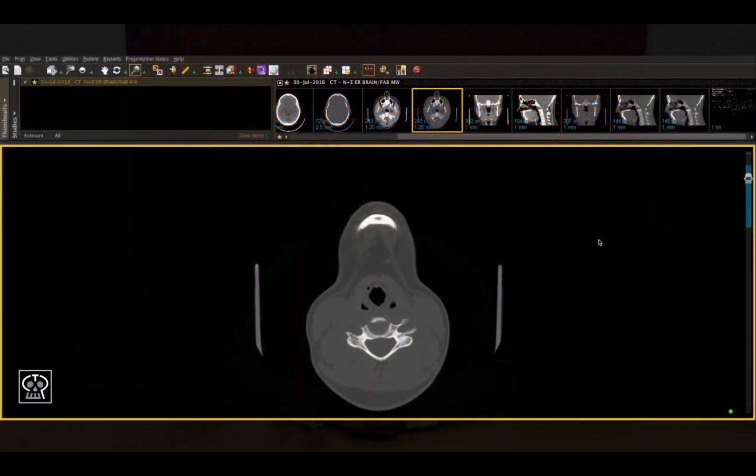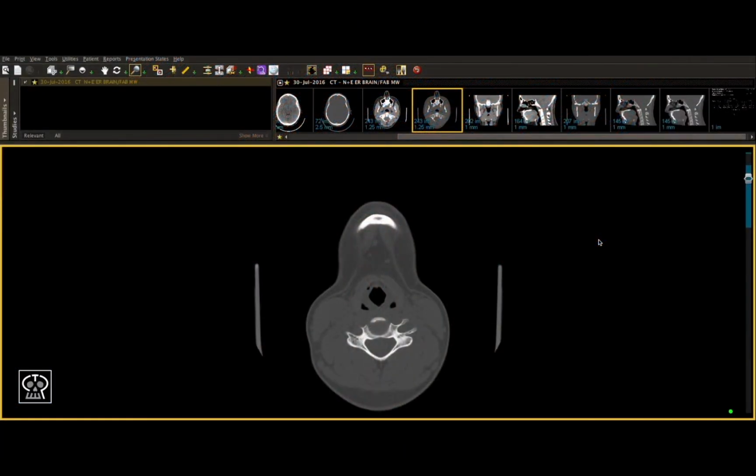Okay, now let's jump onto the computer into a DICOM viewer to show you exactly what I mean when it comes to these three views. Now that you understand the basics of the three views of a CT scan, let's look at them on a computer screen. For the purposes of this course, I'll be using the PACS IntelliViewer to show CT scans.